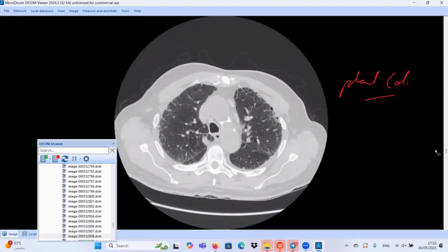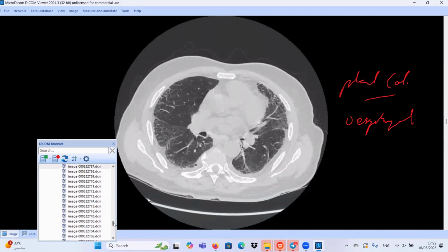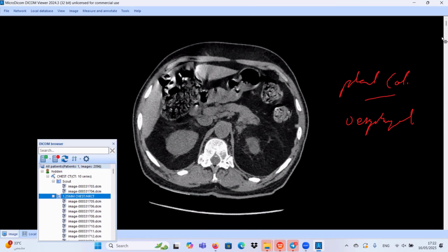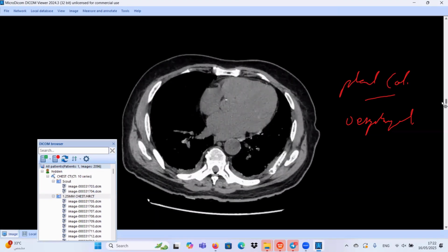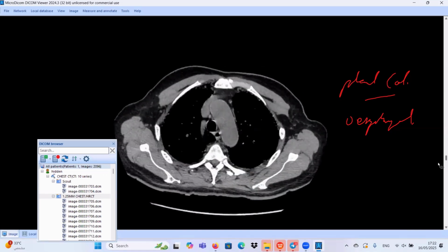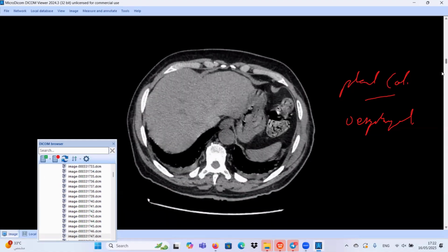Second, we should check the esophageal dilatation. We don't have any esophageal dilatation. If we have esophageal dilatation, scleroderma is very common. Also, you should check the mediastinal window if there is any increase of the liver density, because it can reflect drug-induced usual interstitial pneumonitis. We don't have any abnormal density in the liver.